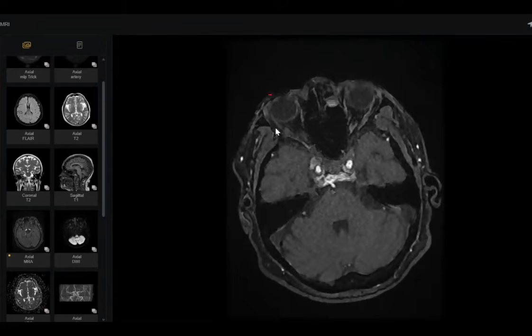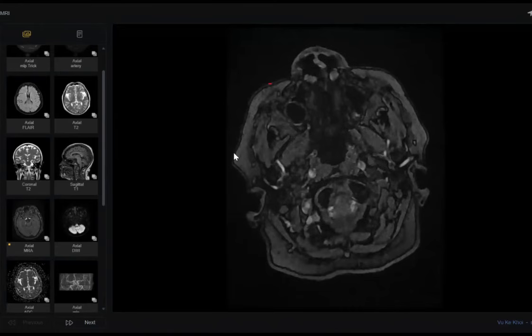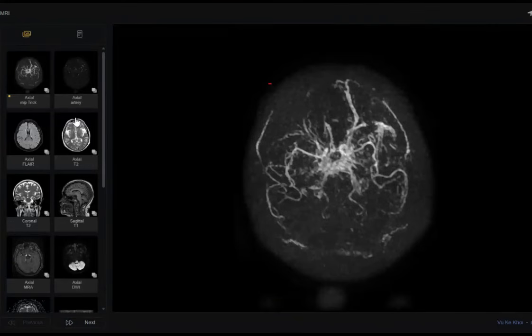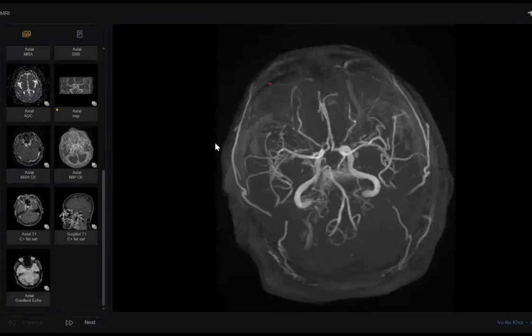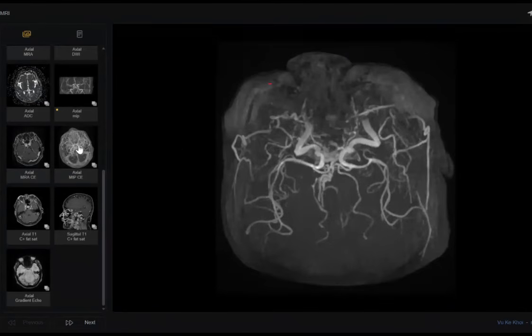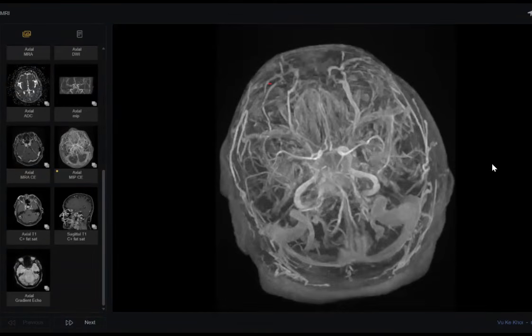Okay. So can we change the image? What do you want, doctor? So can I see the MIP image, the 3D image? This one, or this one? This is better, I think. So, okay, so I'm looking at the... Look here. Let me help you. Yes. Look. So, yeah.